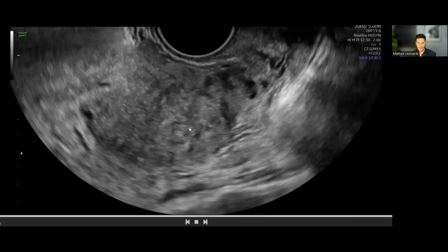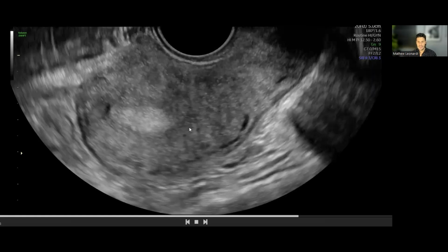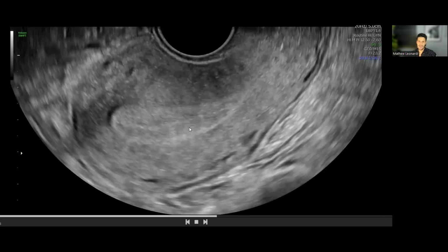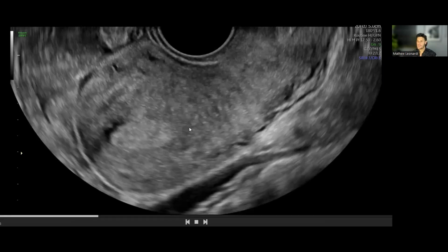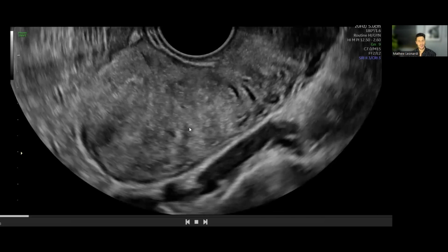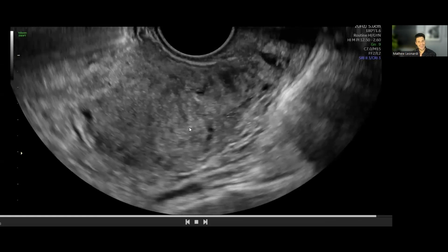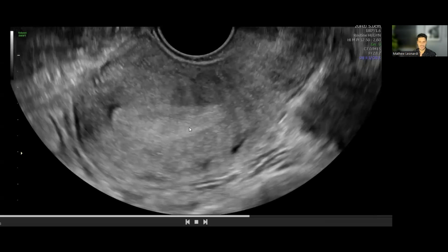Interestingly, it's possible that the polycystic ovarian morphology could be yielding a slightly hyperestrogenic state, which would actually be a risk factor for an endometrial polyp. And so maybe something to think about. If we are seeing polycystic ovarian morphology, are there other things that could be contributed to by a hyperestrogenic state, like polyps, fibroids, endometriosis?